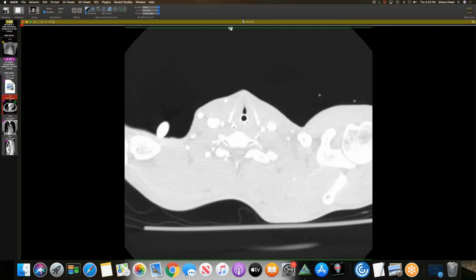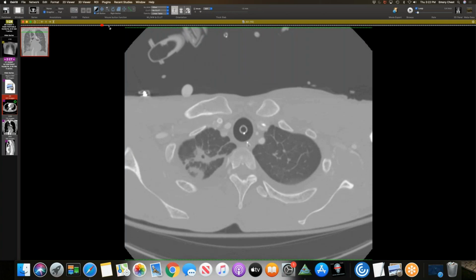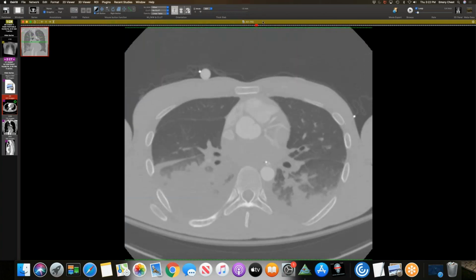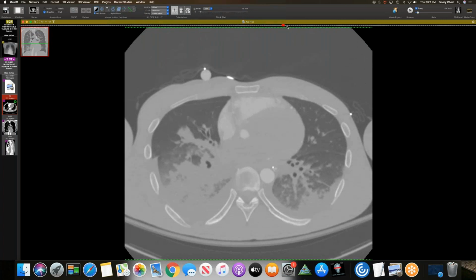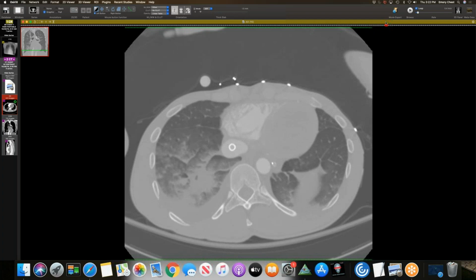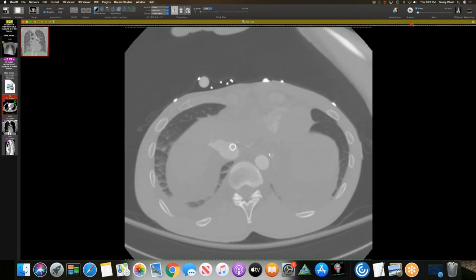Yeah, the CT. Just so we can see. So you can see the superior vena cava catheter and the IVC catheter. So this looks like a veno-venous ECMO, but when I checked the chart, I saw she was on VA, so I called the nurse to verify. They said they switched her and they have a cannula also in the femoral artery, which you can't see on this.